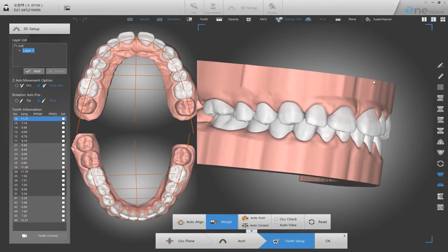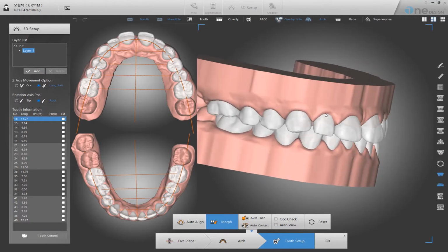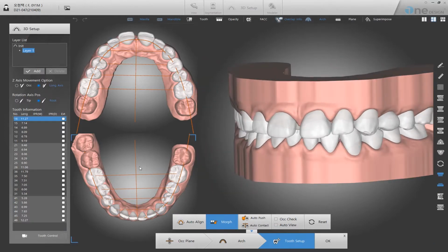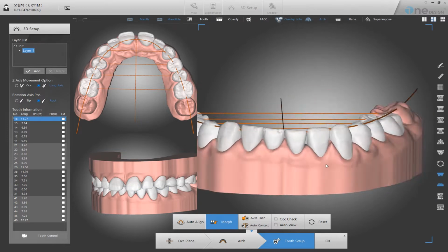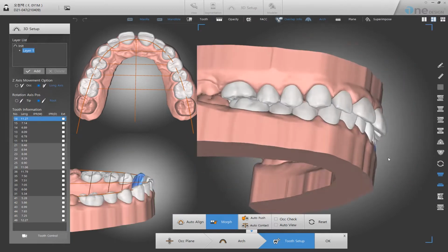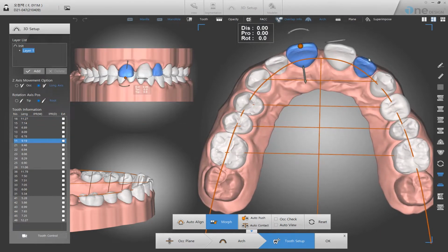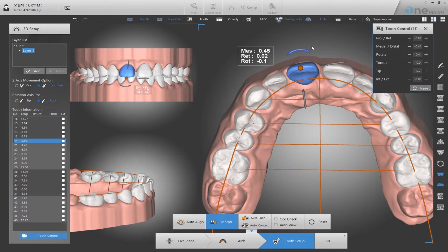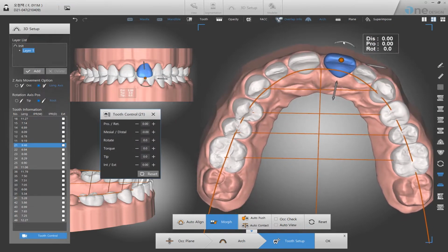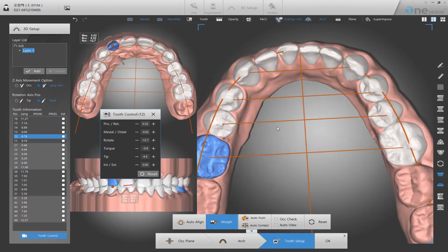This patient has a space between incisors at MN and MX, and especially severe space between central incisors at MX. In the maxillar, we will distribute the space between tooth number 11 and 21 in layer 1. Since there is space, we will perform rotation to fit the ideal arch.